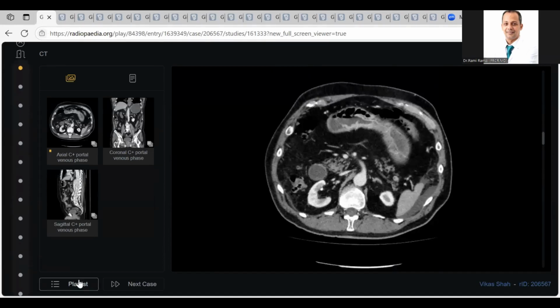Next candidate. Yes, sir, I'm the next candidate. Assalamu alaikum. Severe abdominal pain. Would you request the control, or shall I solve it for you? I will try controlling it. If I cannot, then you can please. Sir, I have requested the remote. Okay. This is post-contrast axial, second portal venous.